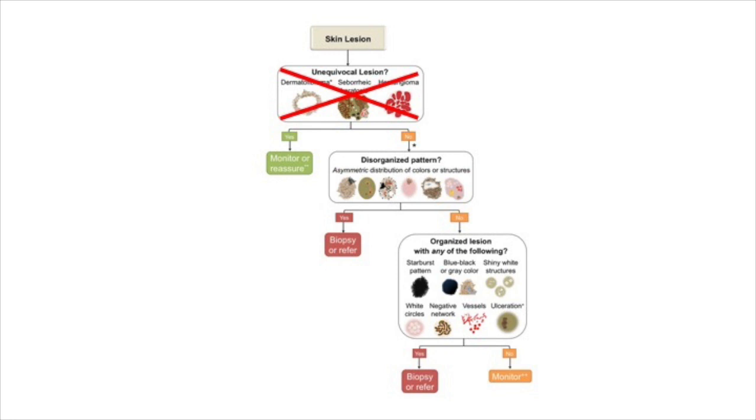Now, what if it's organized? Then what? Here is where the problem arises. Here is where all of those melanomas that gave us nightmares before enter. However, they have something in common, and the common is only what's in this box. That's the only thing you have to know. If it's disorganized, you biopsy. If it's organized, and if it has one of these features, you biopsy. And if it doesn't, you send the patient home.